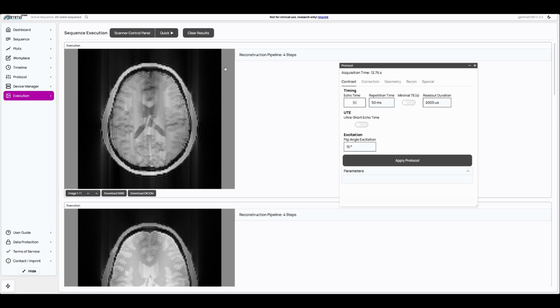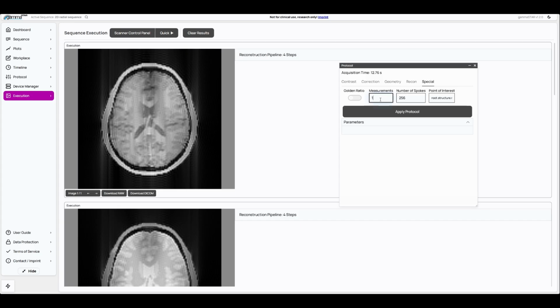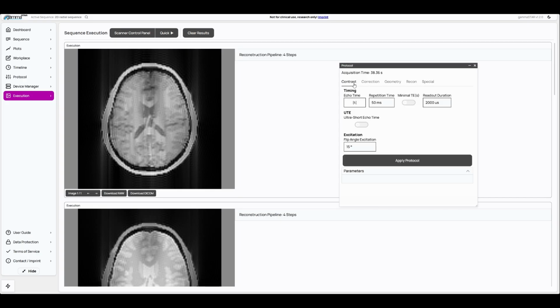our short repetition time. So what you could do to overcome this is you could just add multiple measurements, which means that after a single measurement, where the steady state approach occurs, another measurement is performed, and after that we have one additional measurement, so 3 measurements in total, and we could simulate that and verify the result.